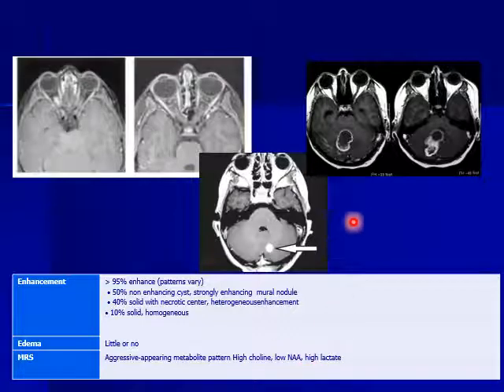So in children, if you see a glioblastoma-like lesion in the posterior fossa, even with a highly aggressive MRS curve, you should think that it may be pilocytic astrocytoma, okay, which is much more benign. Put this in your mind when you deal with a necrotic ring-like lesion like this in the posterior fossa in young adults and in children.